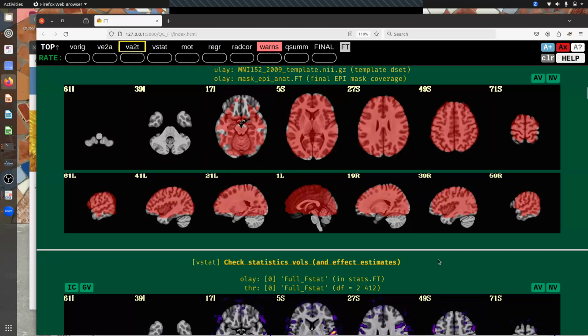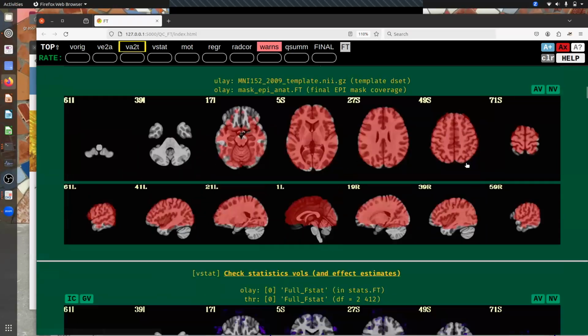So these are the kind of things that, even though the alignment is good and you see the brain overall, the details really matter a lot. Again, if you care mostly about visual and auditory, those parts are kind of colored in. There is some subtlety to the QC.